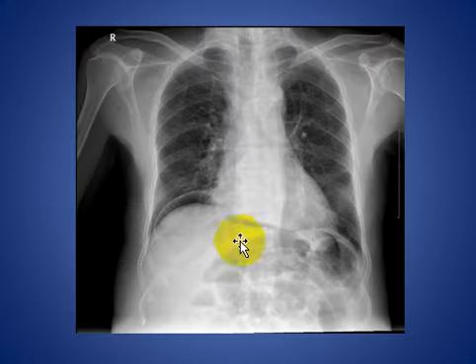Here we have also air under the right diaphragm and air under the central tendon of the diaphragm, similar to cupola sign in this supine film.